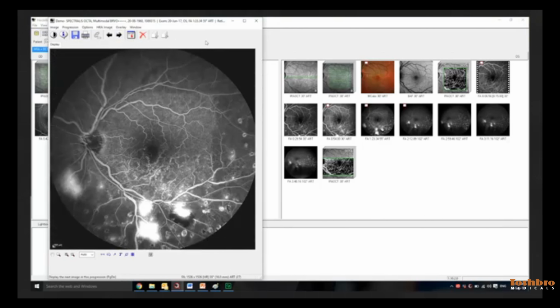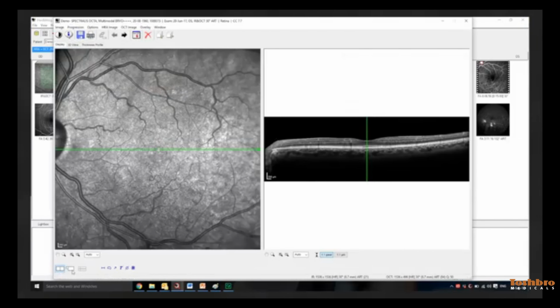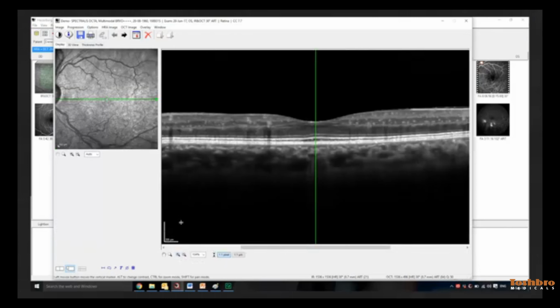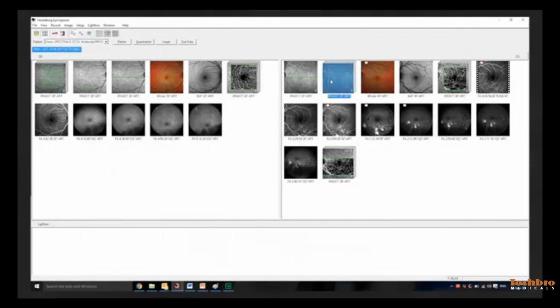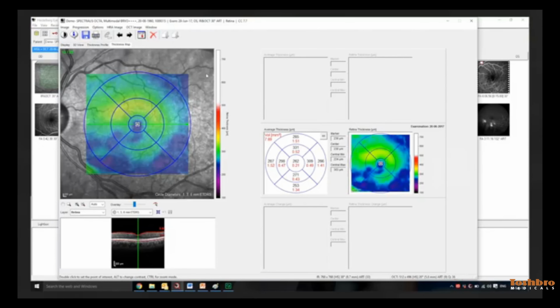It's important that the small field of view captured with OCTA may miss key clinical characteristics that help with the diagnosis. An example of this would be peripheral neovascularization due to diabetic retinopathy. Analyzing structural OCT and a retinal map would be important in identifying thickness. Thickness is not information that would be gained from OCTA. Structural images may provide surrogate information about breakdown of a blood-retinal barrier or atrophy.